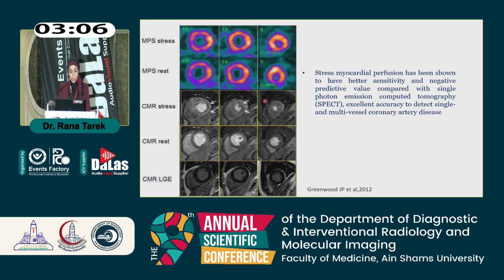And it has been shown to have better sensitivity and negative predictive value compared to the SPECT. Like here, this is the same case. I can detect here the perfusion defect in ischemia, but here on the SPECT, I couldn't detect it.